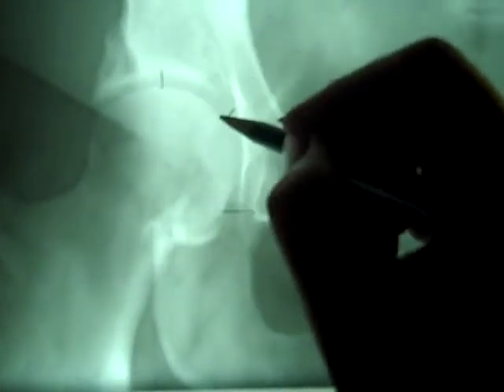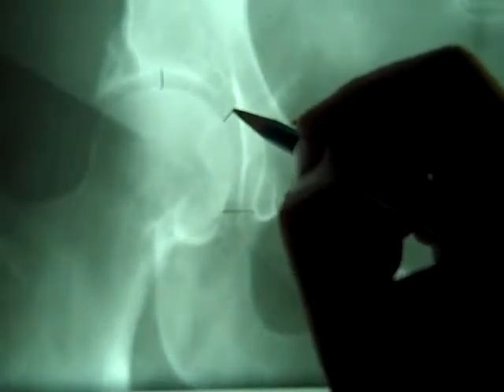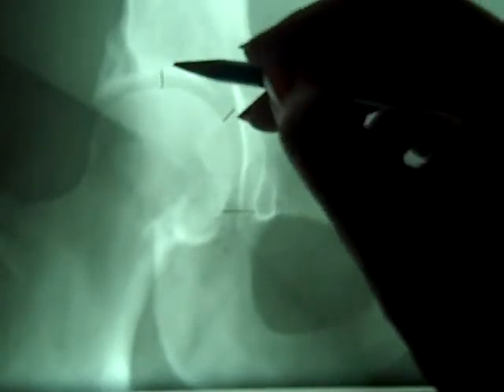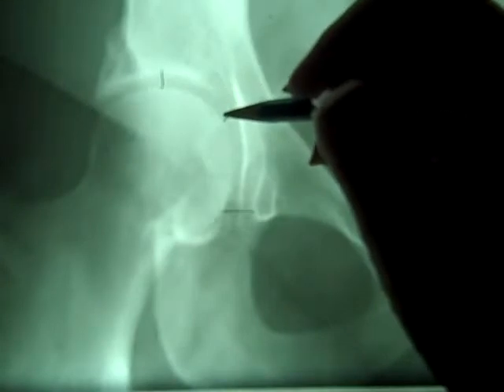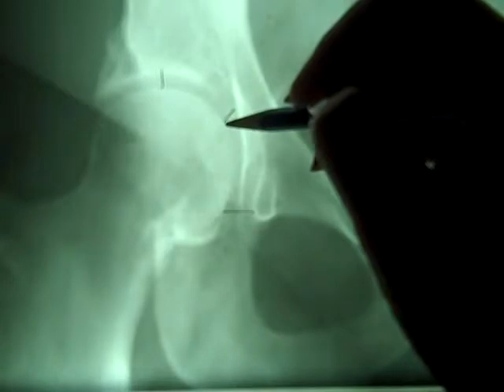So superior and axial are usually around 4 millimeters, but more importantly is that they should be equal to each other. So if both of them measure 4, everything is good. If both of them measure 3.5, everything is good. It's when one measures 3 and the other one measures 5 that you've got a problem, okay?